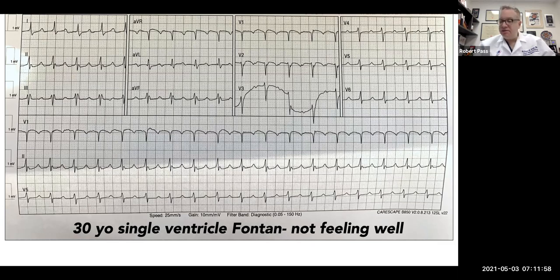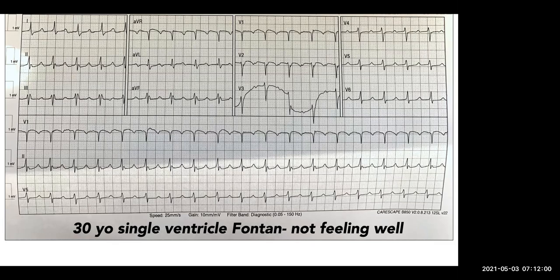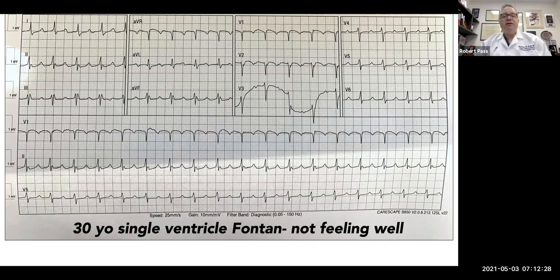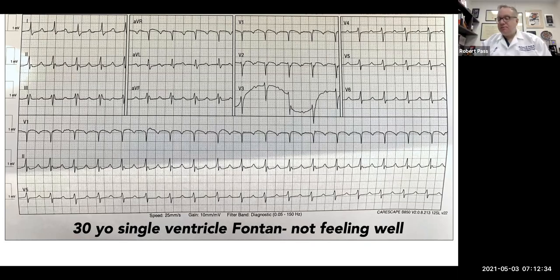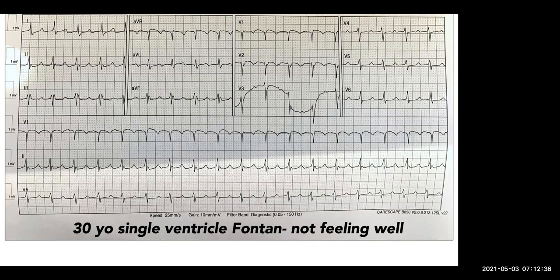I like that idea. So I don't see any obvious P waves, and I don't have a prior EKG. And again, the QRSs don't seem wide. So one alternative I have is if this is a junctional rhythm in this patient, maybe some sinus node dysfunction, and the patient is in some junctional rhythm. Well, if somebody were junctional at 110, would that be consistent with sinus node dysfunction? No, actually, that's faster. That would be like an accelerated junctional.